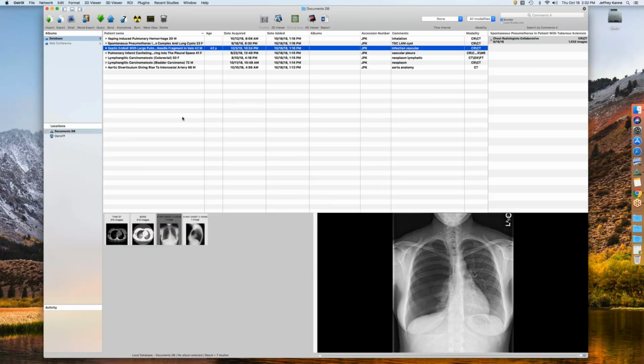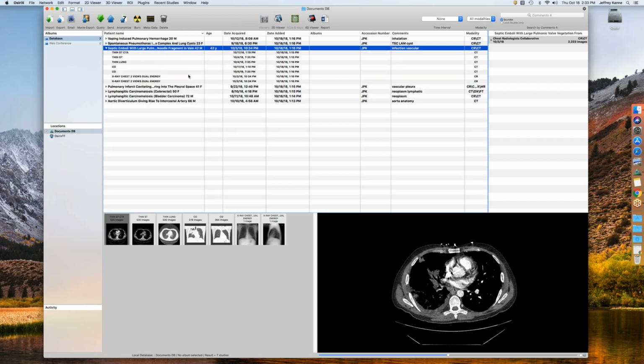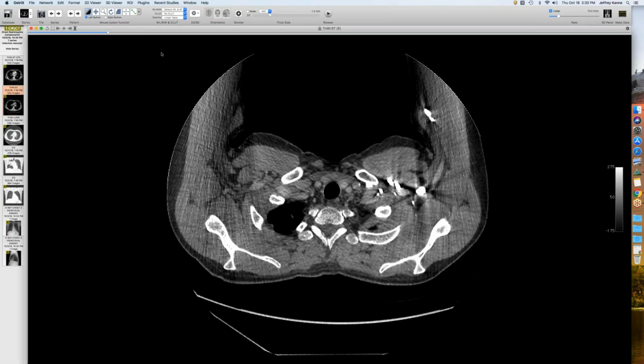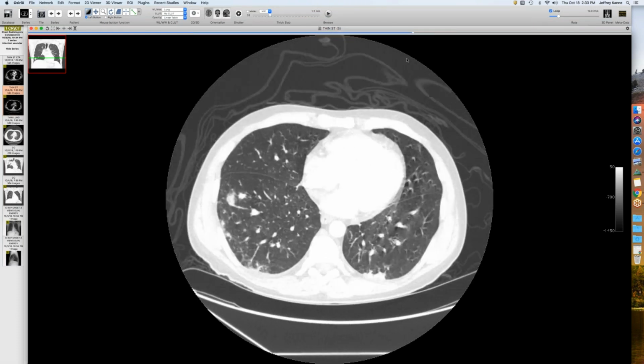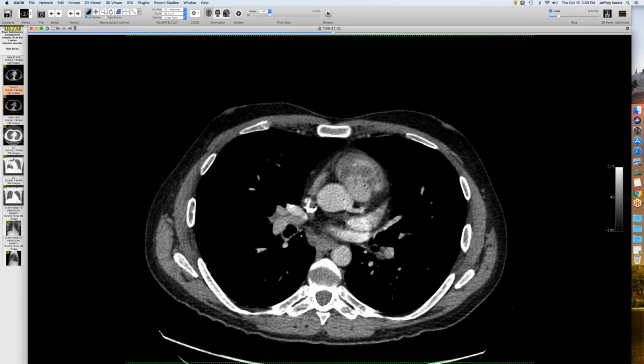Okay. So this is follow-up of a case I showed last week. I'll make sure I show the right image. I'll show the old CT first. So this was the IV drug user who came in sick, who has septic emboli everywhere, and this monster vegetation on the pulmonic valve.